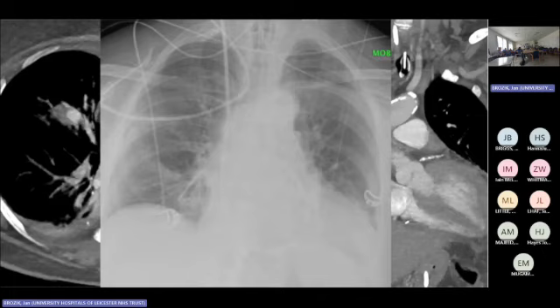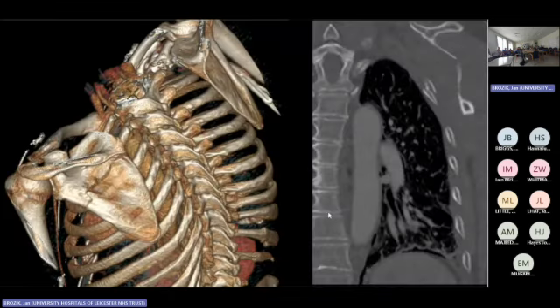They're still alive. They had surgery, their heart was repaired, we injured the pulmonary artery. The vascular radiologist embolized it, and the patient leads a happy life, which is great. But review a series of X-rays, understand what really happened to the patient, then you will understand it.